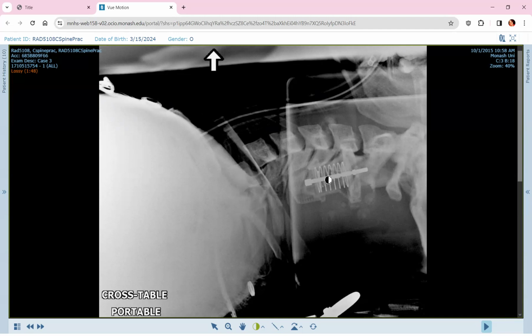Very difficult, of course, to see the rest of the bone because there's quite a lot of artifacts across the spine, and this patient would obviously be referred for a CT scan as well. So the main finding then is a C6-7 bilateral facet dislocation.